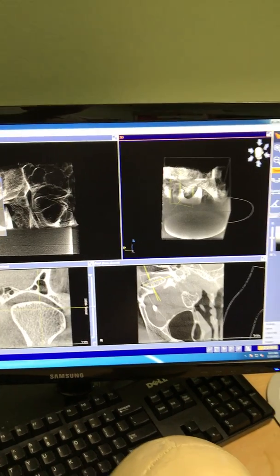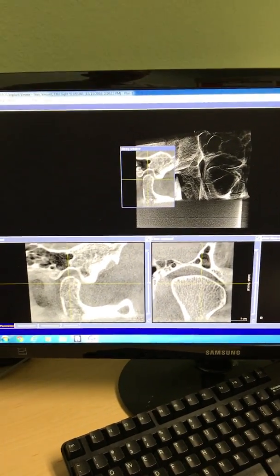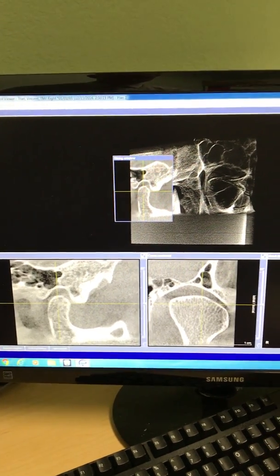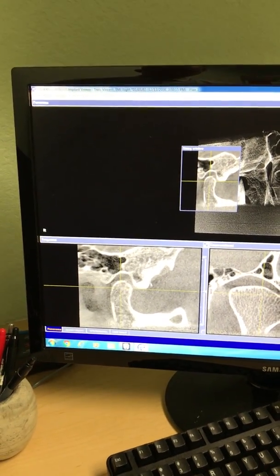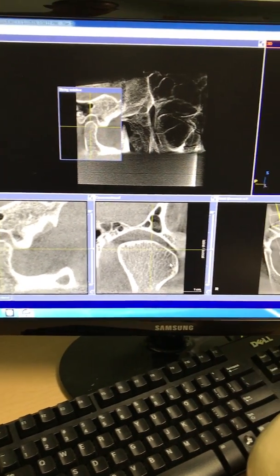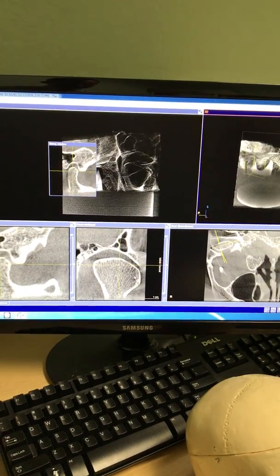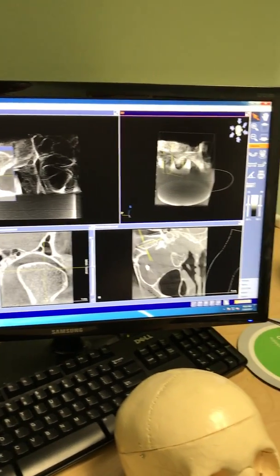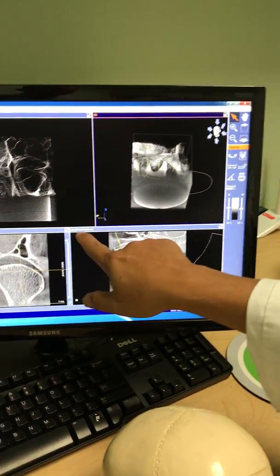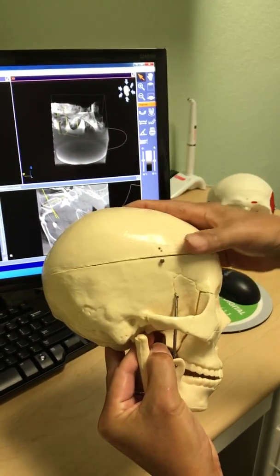There are actually three cross-sectional views that we'll be looking at. This view is like the tangential view that's going to be magnified over here. The other view is called the cross-sectional. It's like this kind of view right there. And this view is the view from the top. It's called axial, from above. That's looking down from the top over here.